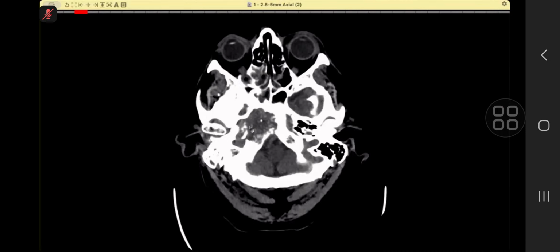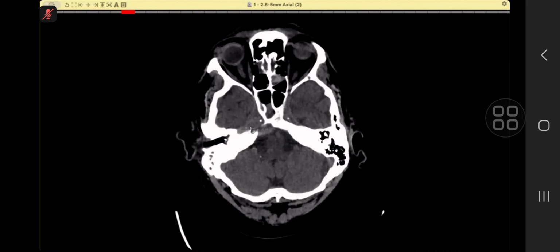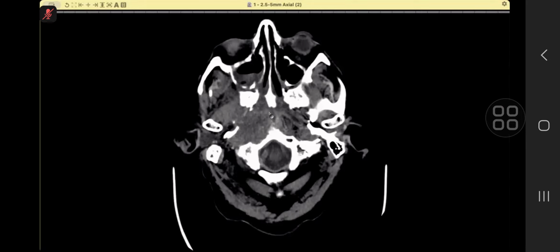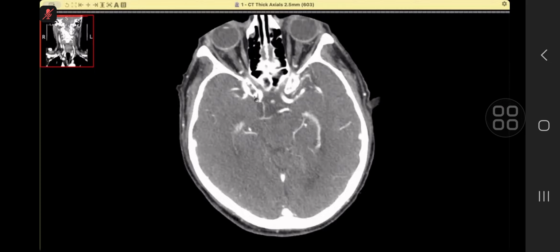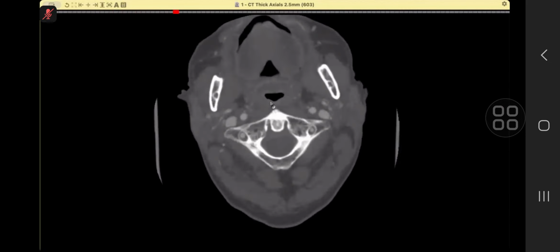Slightly off midline, and you call it. So the idea in head and neck is that because of this epicenter, you will say that this is it. If I go into the nasopharynx, I don't see it. But if you say that in my differential, nasopharyngeal carcinoma, I will take it. I will still take it. Having said that, this calcification also goes in favor of chondrosarcoma.